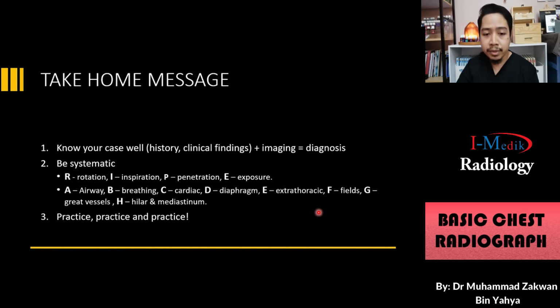Okay, we need to be systematic in reviewing a chest radiograph. Okay, we need to assess the quality itself. In any suboptimal study or image, there will be expected limitations, so we don't expect much from a suboptimal study.